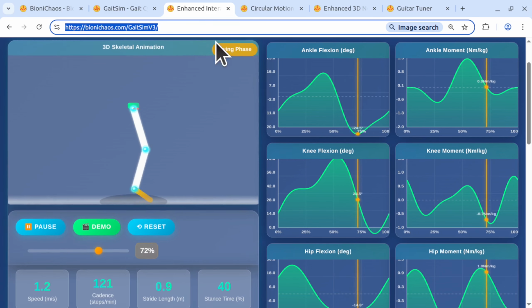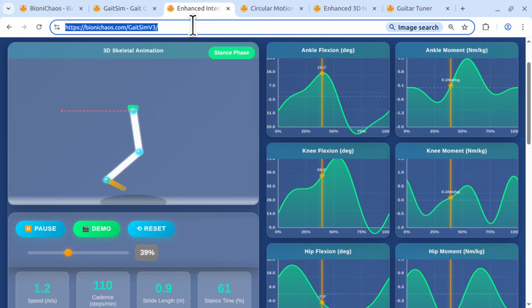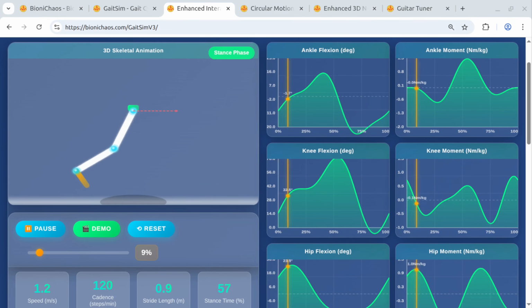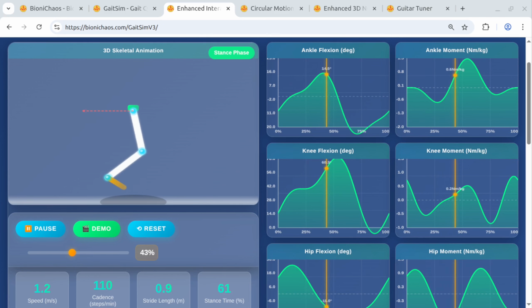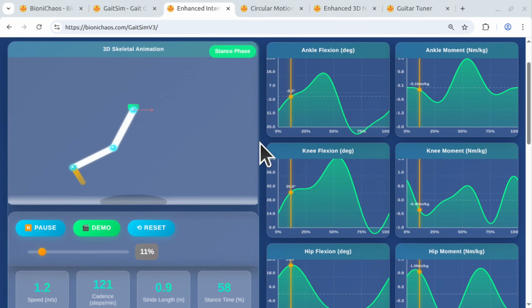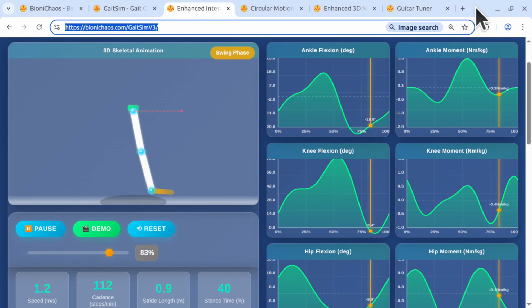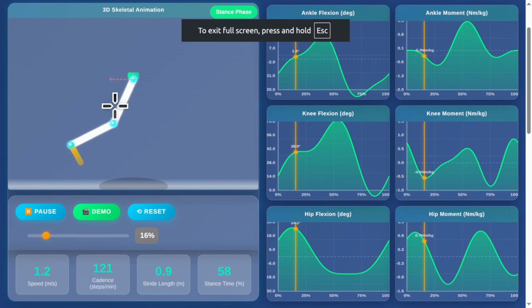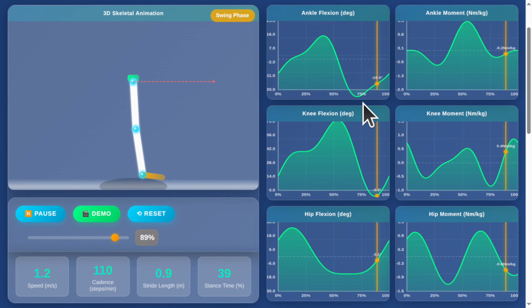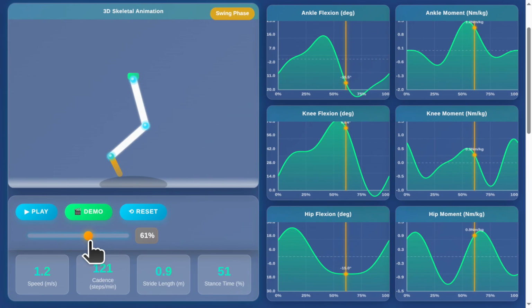So in a similar fashion, with a tool like this, which I popped the link for in the chat and will be in the comments of the video as well. Once you have the charts on the side there, your perception of what the foot is doing changes because you actually see the graphs. Well, the question, how does it change?